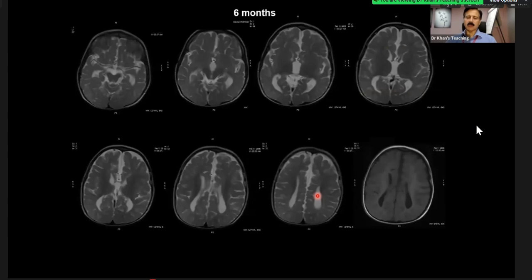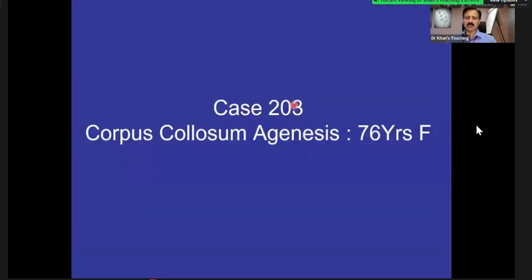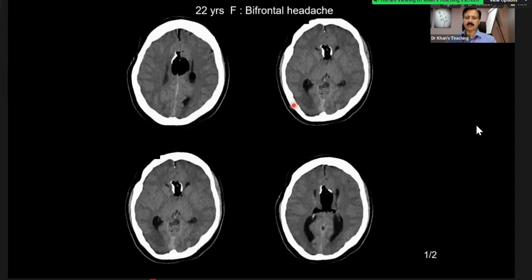With that, please remember that there is a concept of colpocephaly, where the occipital horns, because of the orientation of white matter tracts adjacent to it, also appear dilated. So this is the same spectrum. The third ventricle has moved superiorly. So this is corpus callosum agenesis. And what do you think is happening here?